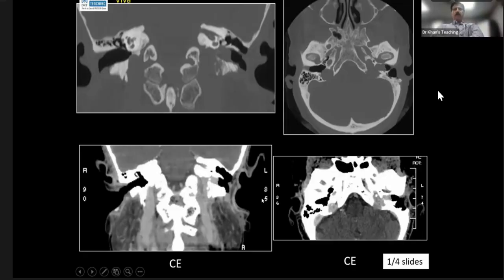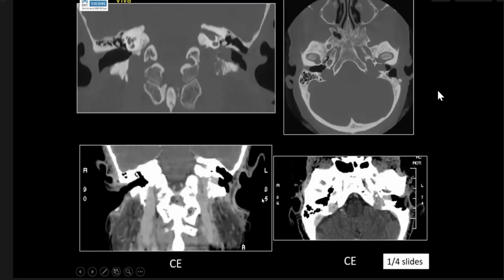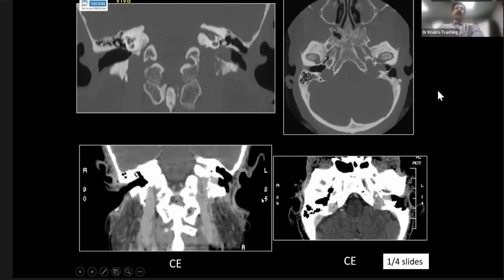It's a type of paraganglioma, quite similar to glomus tympanicum or pheochromocytoma. So everything is correct, whatever you said about this particular location. Yeah, but I am not satisfied with the location. Everything you told me is absolutely correct. But you use the word glomus jugulare. This, what part of anatomy is this? Oh, sorry, tympanicum. Okay, tympanicum.